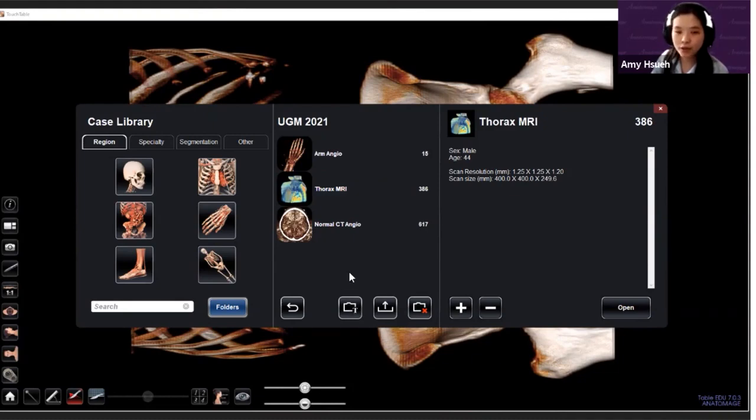And once you have that, or if you have any folder, you can actually rename it as well, if you decide you don't like this name anymore or it's no longer relevant. Right here, there's a little T over the folder. If you click on that, you can rename the folder to something else. So you change it up.